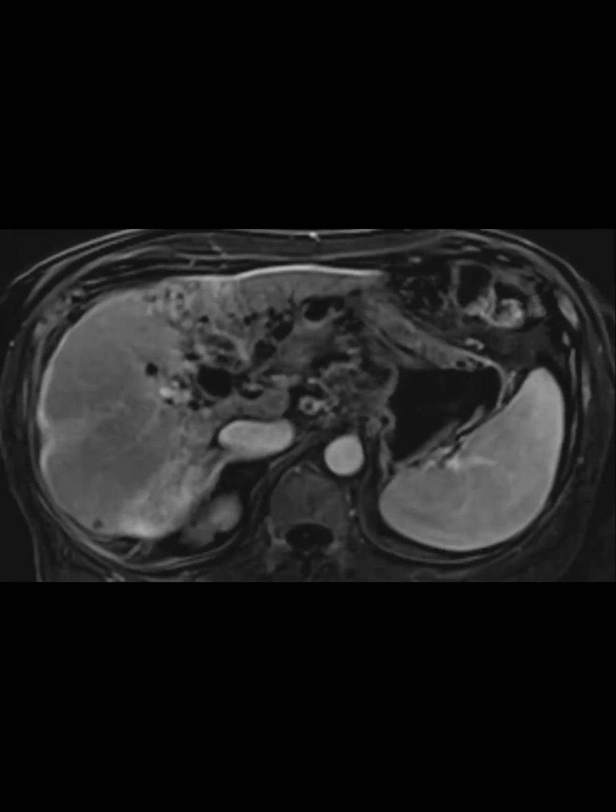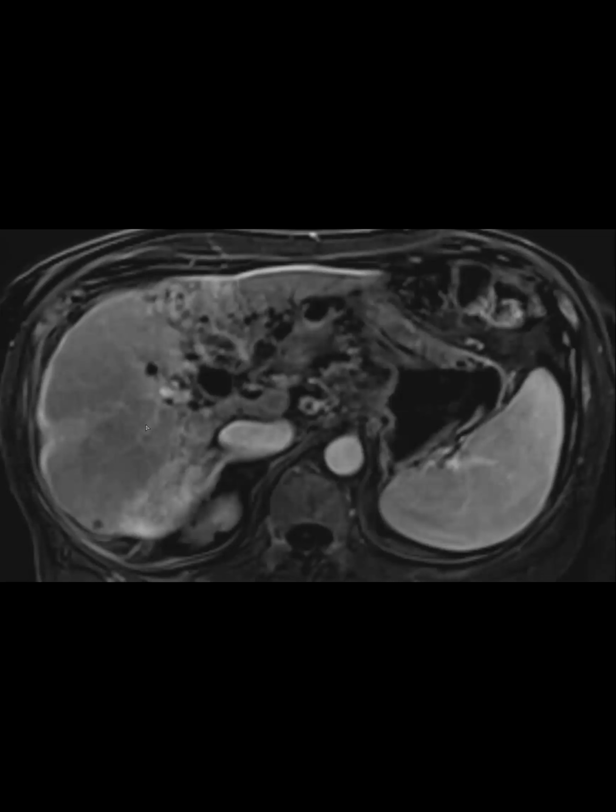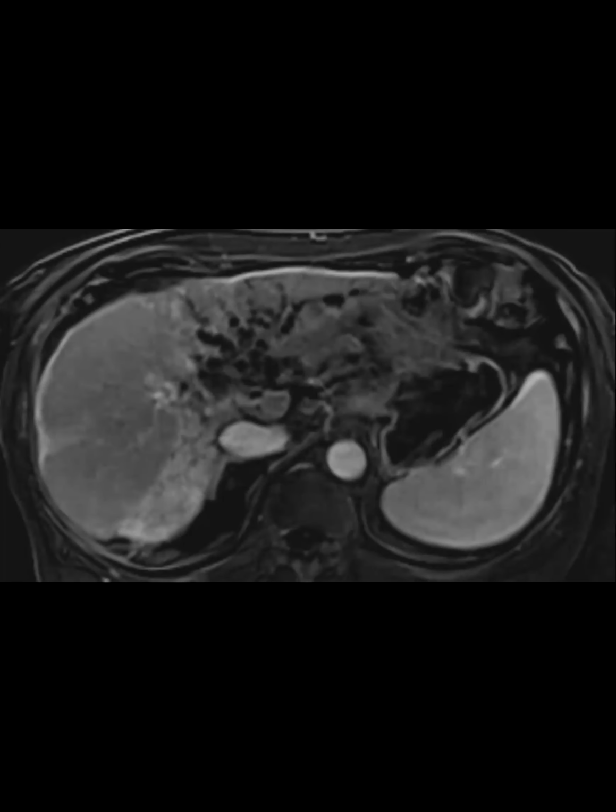Anu, what's up with those areas in the right lobe? They've been treated. There's fibrosis and they've had HCC, so they've undergone ablation and separately been treated for HCC. Got it. It's always amazing to me how the mural stuff in these IPMNs can be so imaging occult. We're struggling to see something there sometimes, and then on final path, they probably do have something, because something has to be creating the mucin. Right.